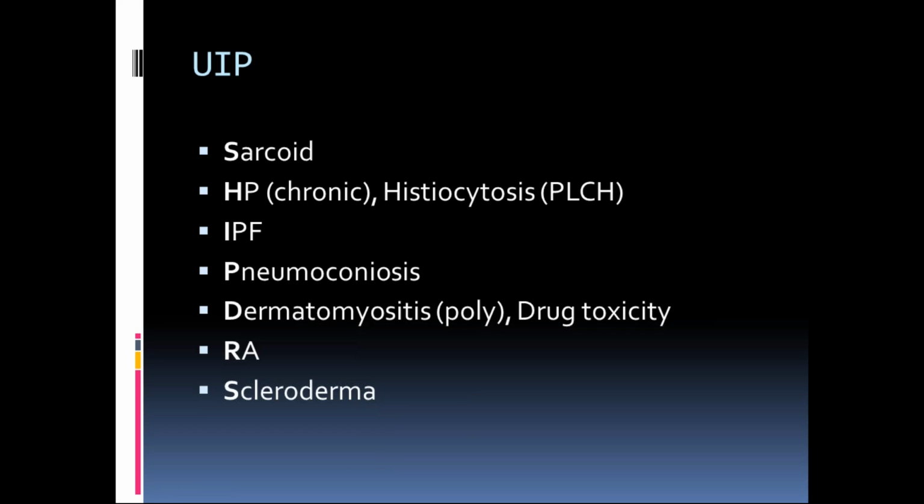So what do we do with UIP? Because UIP is a pattern, it's not unusual for me to have in my impression that interstitial change is consistent with a UIP pattern. A lot of times my dictation ends that way because basically I'm leaving it up to the clinician to find out why they have it, because there is a large laundry list of diagnoses that have that same type of pattern. So you can see here, and being able to speak intelligently about it to your referring clinicians or to a board examiner, that these are the type of things that you would think about.